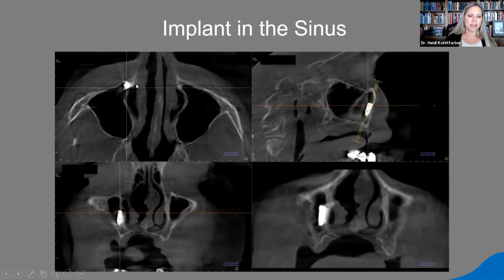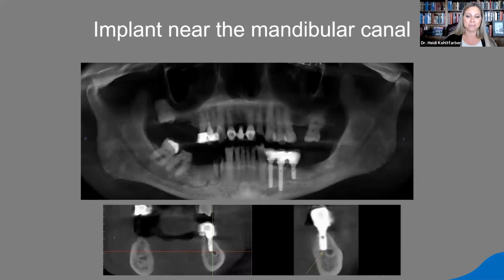This was a patient that had a history of a failed implant. They were new to this particular office. They took the CBCT, and guess what? We found it. So the nose is up. It is located anteromedial to the sinus. It has actually osseointegrated along the lateral cortical border of the nasal fossa. And so it will live out its life there. See, the majority of them do osseointegrate wherever they're at.